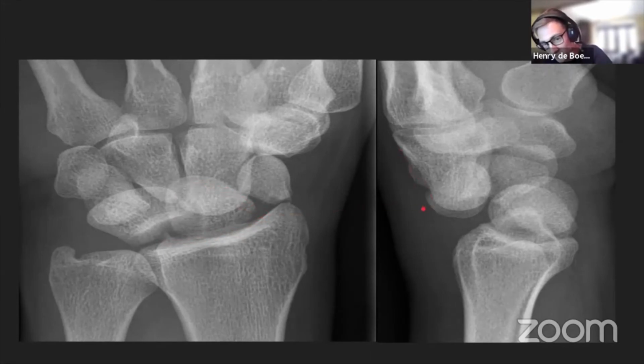And the lateral shows us why it all looks so funny. So if you remember, we should have the saucer with the cup, and then the capitate, which people talk about as the apple, is dorsal to that. They're not sitting in a nice straight line. We'd want this sitting here. So there's this carpal dislocation, and there are different classifications.